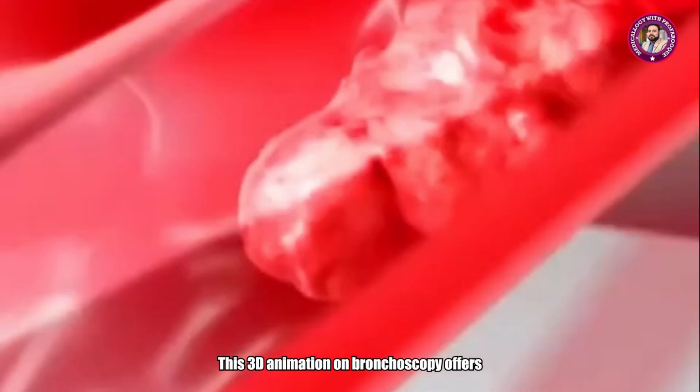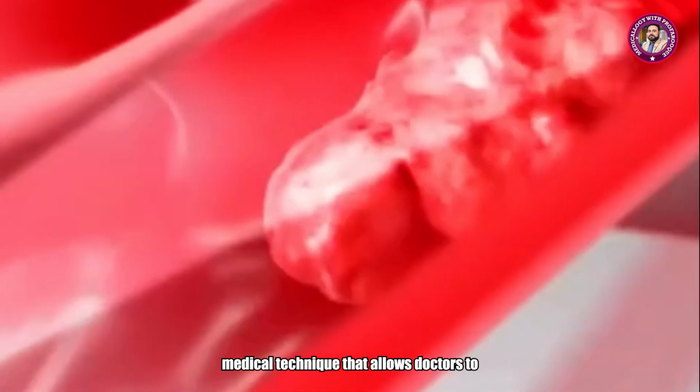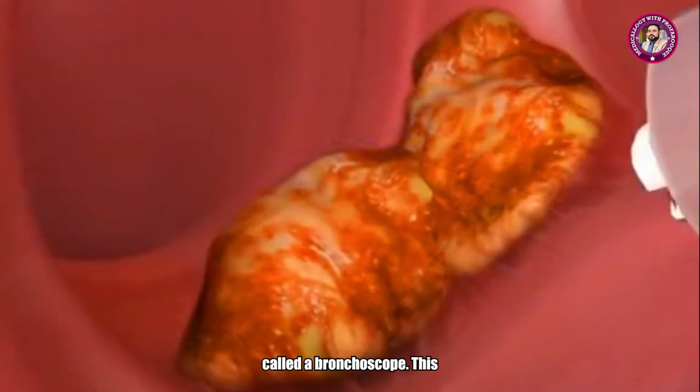This 3D animation on bronchoscopy offers a detailed and visual explanation of how the procedure works. Bronchoscopy is a medical technique that allows doctors to examine the inside of your lungs and airways using a thin, flexible tube called a bronchoscope.